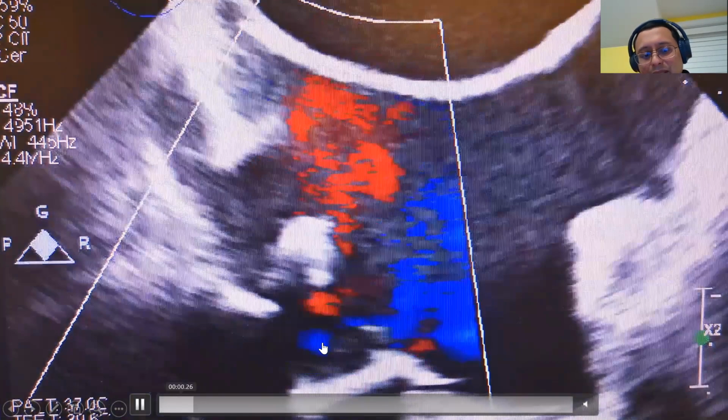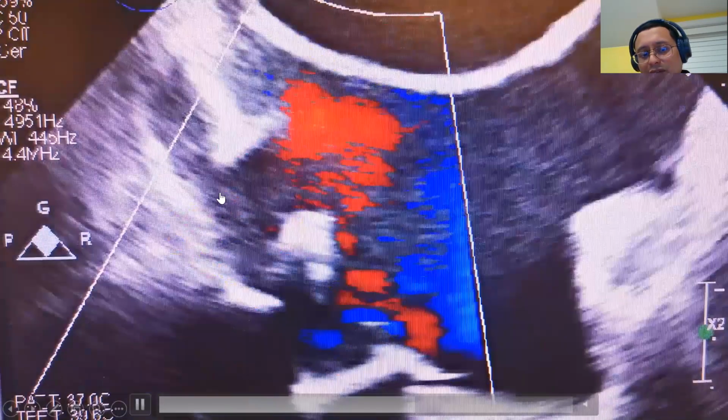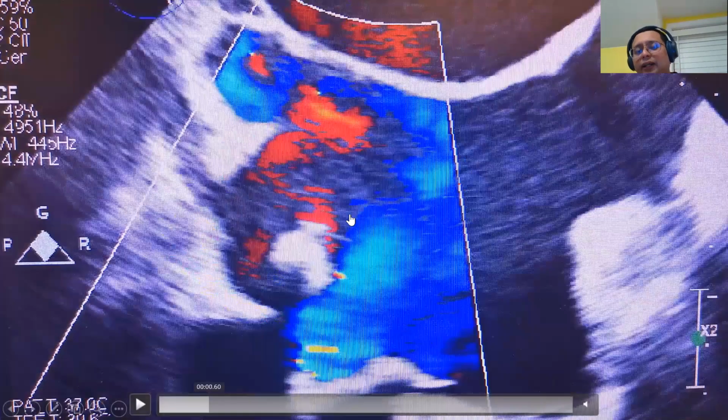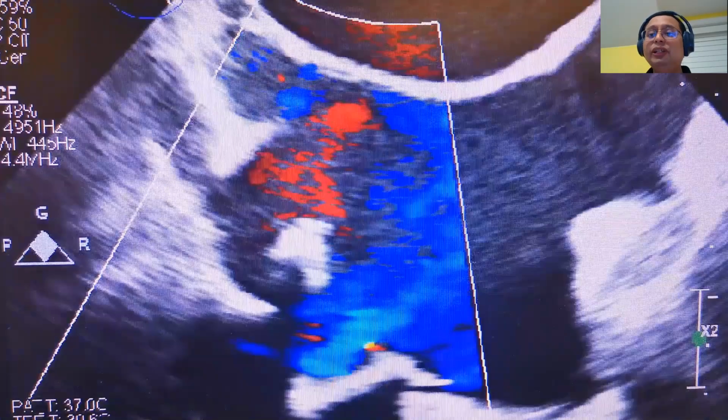So I play again. Look at the jet. It goes into the eustachian valve to the interatrial septum. Jet from the periprosthetic tricuspid valve to the eustachian valve to the interatrial septum. Okay, I find it interesting. It repeats what happened in fetal life.